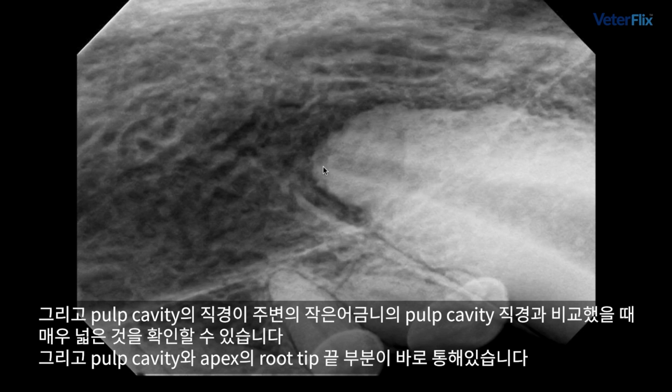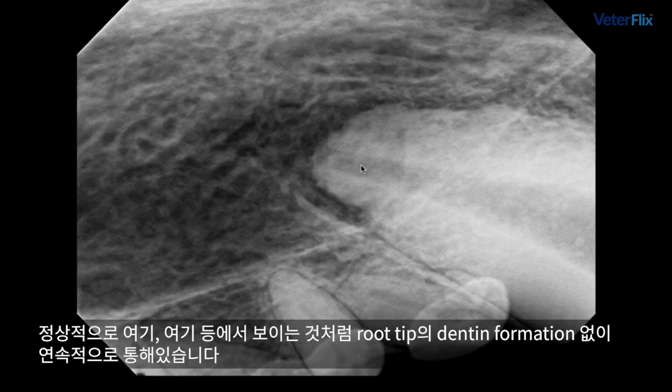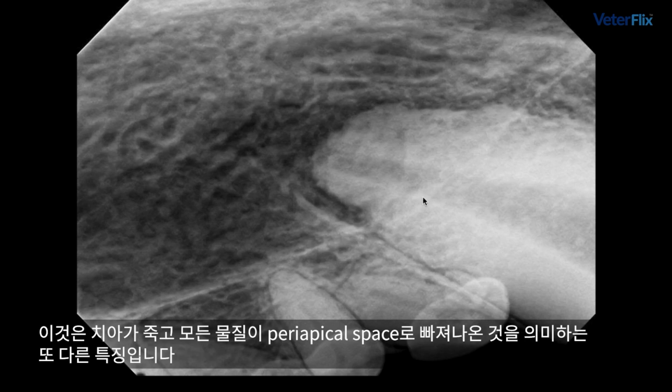And if you also notice, the pulp cavity diameter is very large compared to the pulp cavity diameter of the adjacent premolars, and you also have a direct communication with the pulp cavity and the very apical portion of the root tip or the apex. There is no stop here. It just continues on without any dense dentin formation here at the root tip like we normally see, as we see here and here and here. So that is another manifestation of the age of this patient, when that tooth died, and the extravasation of all of that material into that periapical space.